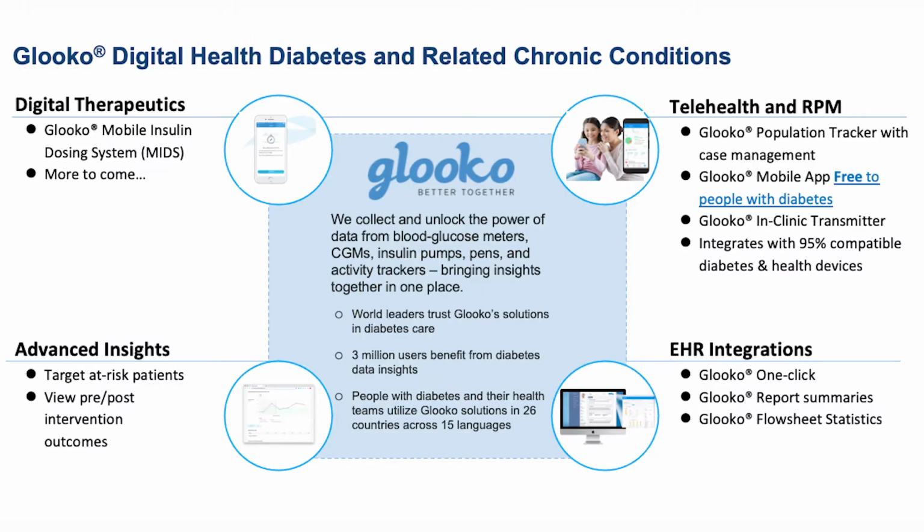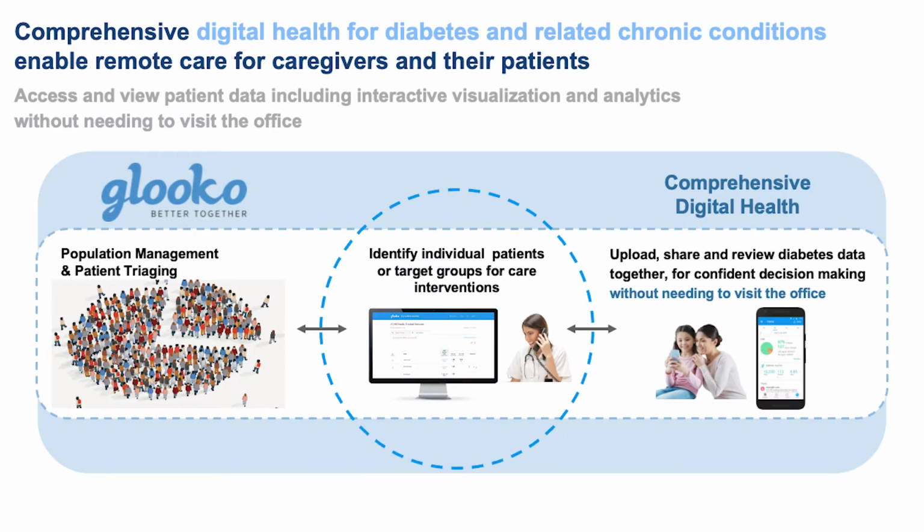Tie it all together. One complete solution for personalized care. Glooko Enterprise is a connected, comprehensive chronic disease management platform with advanced visualizations and reports, remote patient monitoring, full EHR integration, risk stratification tools, and mobile insulin dosing system, MIDS, for personalized care aiming to improve outcomes for people with diabetes. It is a platform that meets patients at their level of comfort with our agnostic approach to device compatibility.